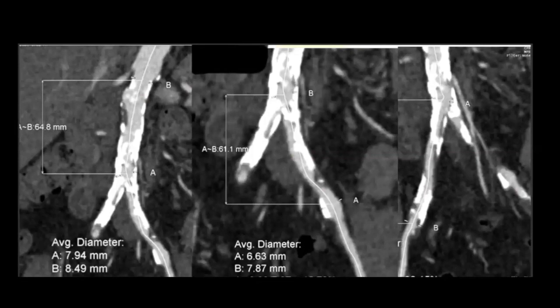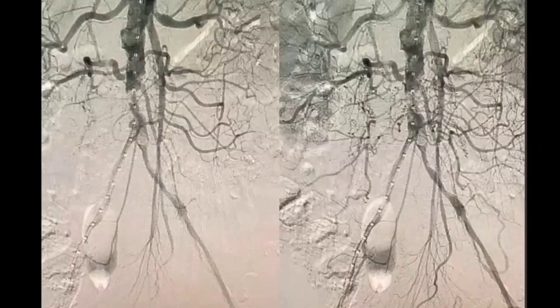So just to say, for this patient I should have shown you the CT first, but I thought showing the angiographic images, I think you get asked these quite a lot, would be more appropriate. I think you guys are really good at your CT. So obviously this procedure was planned based on the CT scan. You can see heavily calcified distal atherosclerotic calcification here, which corresponds to what you can see here.